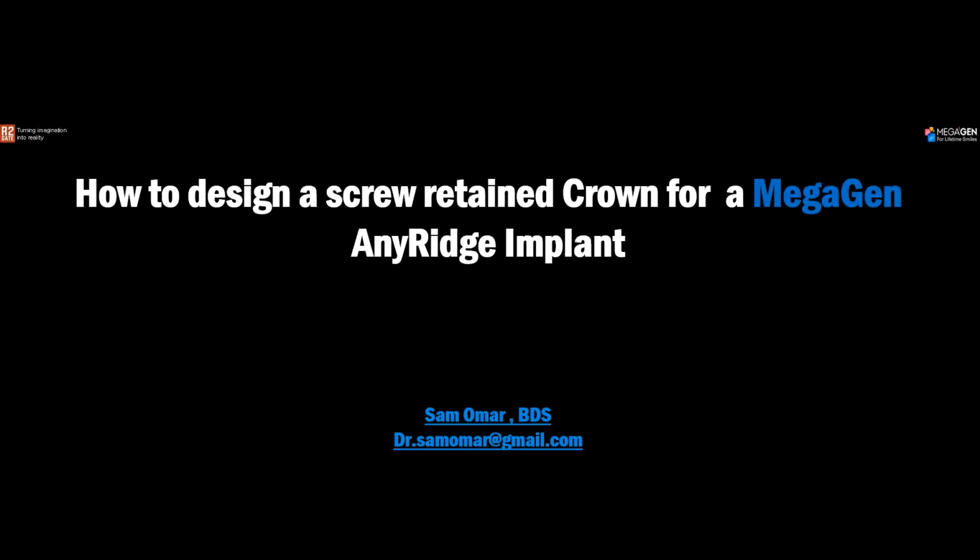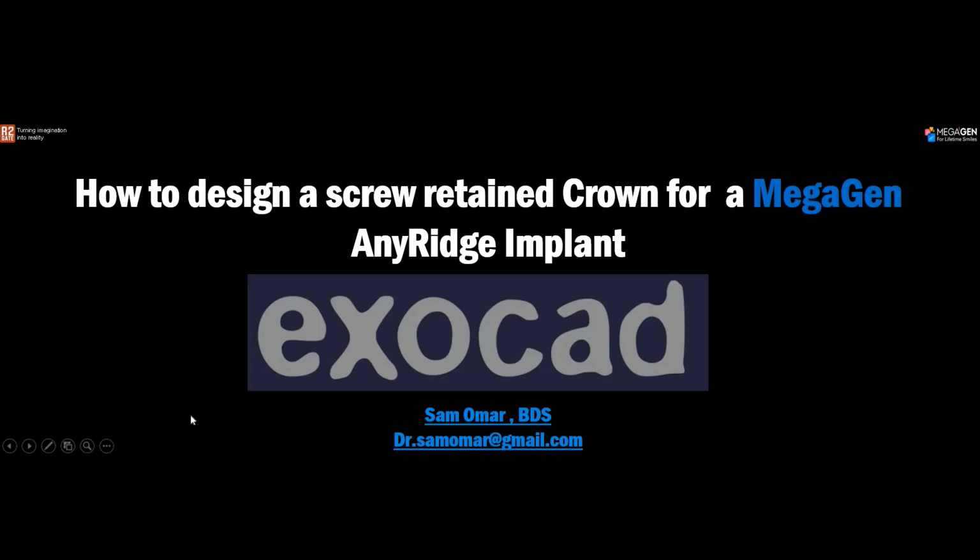In this video, I'm going to be showing how to design a screw-retained crown for a Megagen AnyRidge implant using the Exocad software.